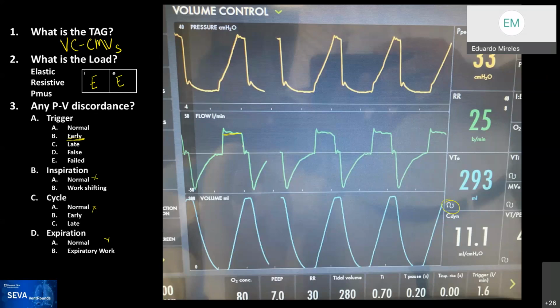It includes how it would look there based on the change in circuit compliance, not the tube compliance, the circuit compliance. And this was something that we didn't know. It's not in the darn manual, to my knowledge, and it was disclosed to us by the engineers of the device. So in these circumstances, that would be the telltale sign: when you see this and you don't see any other volume control activity that takes you there.